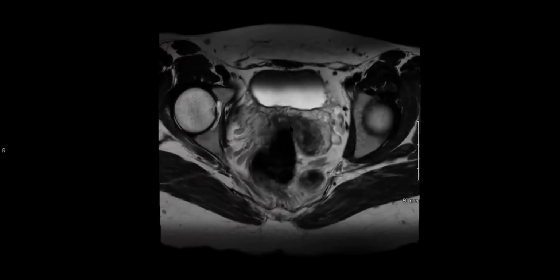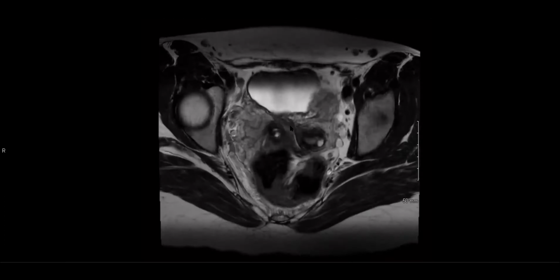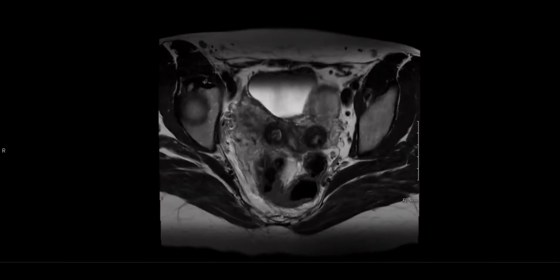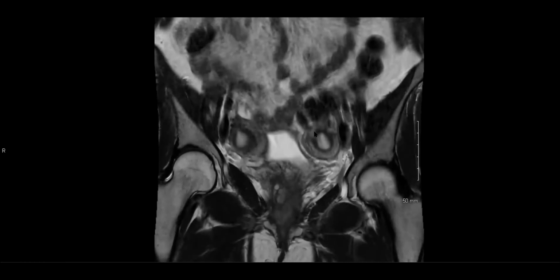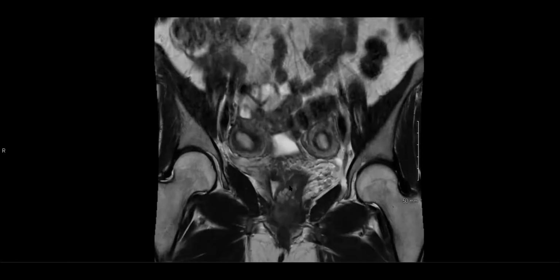So we opened this case and my first thing was like, oh, this is a very adorable case of didelphys. Clearly we see 2 cervices, so it's not a unicornuate. We see 2 cervices with 2 horns. There's absolutely here the 2 cervices. You can see that there's absolutely no communication between the cavities at any level, which would differentiate full didelphys from bicornuate, bicollis.